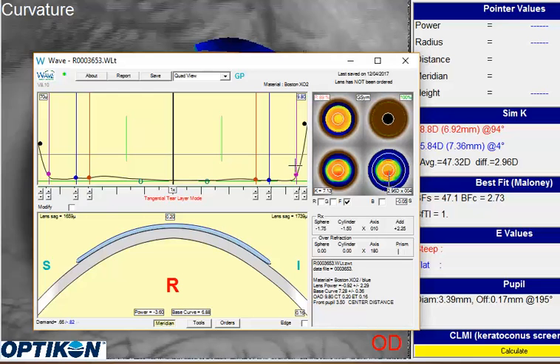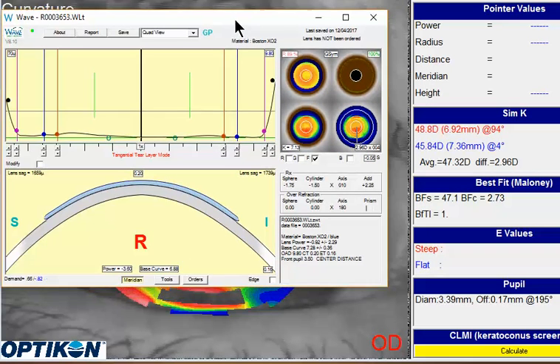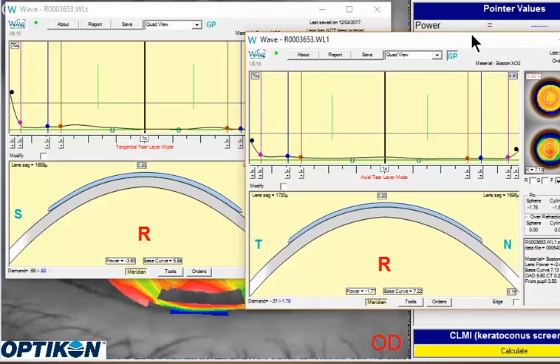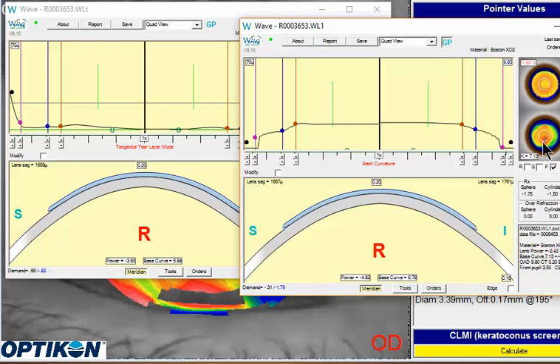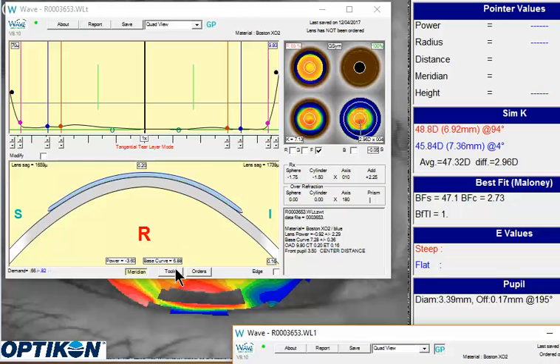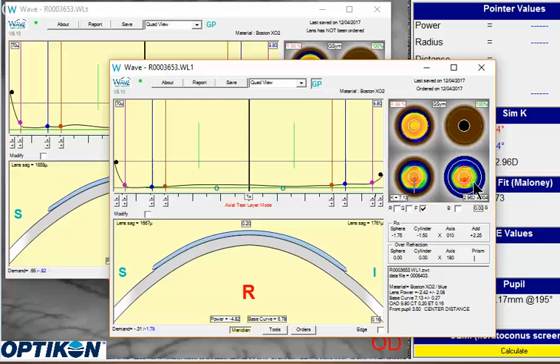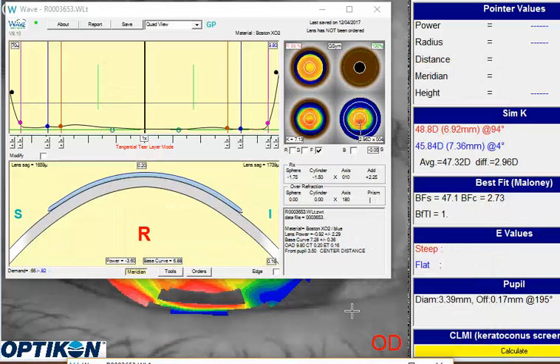It looks very similar to your original lens, but one thing you may notice, if you look now at these meridians, I'm going to pull up your original design here. You'll see if you look in the vertical meridian, inferiorly you got a base curve of about 6.78, and in the new design you're at about 6.88. So it looks like you've flattened that lens up a little bit, and if you look around each meridian you'll find that this newer lens is a little flatter. I think going to this approach you should be able to better align that lens in the peripheral cornea.